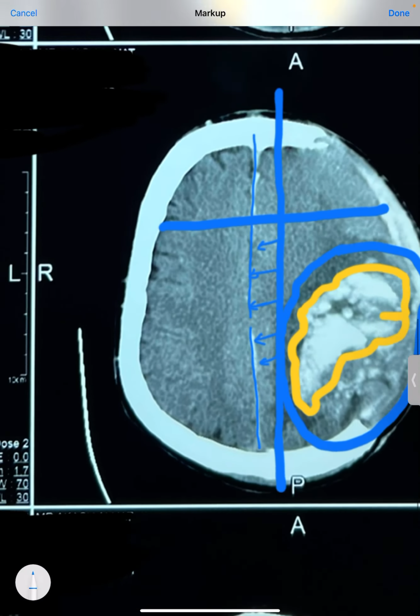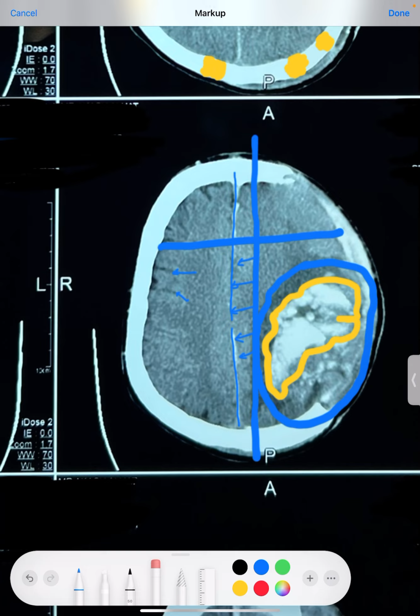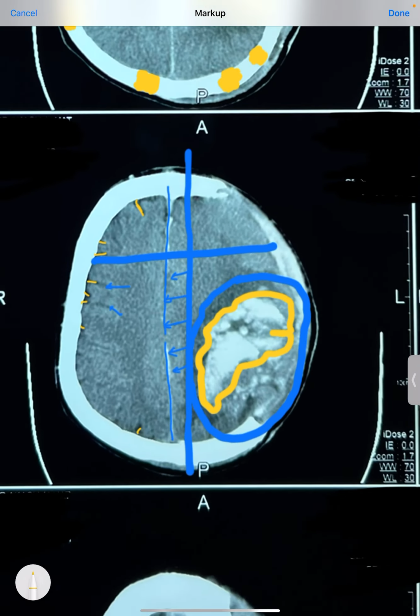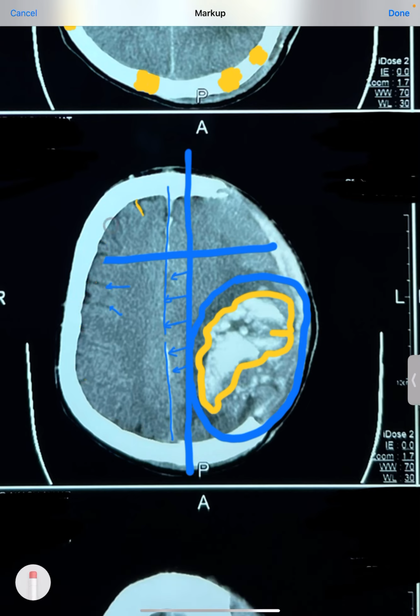What other things can we notice? The normal brain on imaging should have very clear, crystal clear sulci and gyri. So this is sulcus. This structure, this deepening of the brain tissue, is sulcus basically. This is sulcus. So it means that the brain has space there so that it can occupy. This is all sulcus. I'll simply clear out these things so that you can clearly see this.